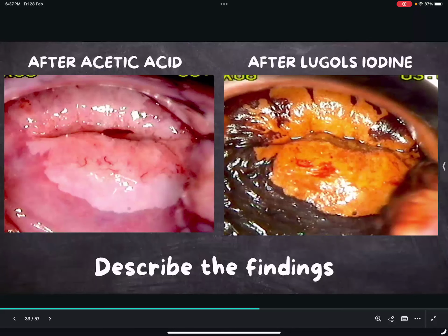No problem. And for the comment on transformation zone, it is always better to go for serial images. One particular image does not give a good interpretation. See, yes, that's what I just wanted to convey.